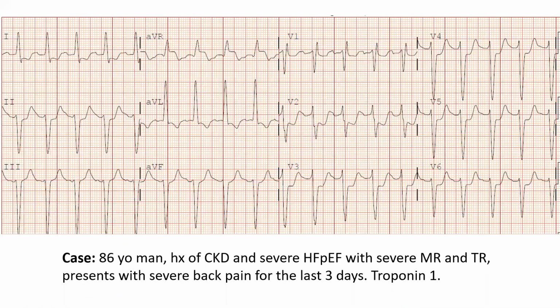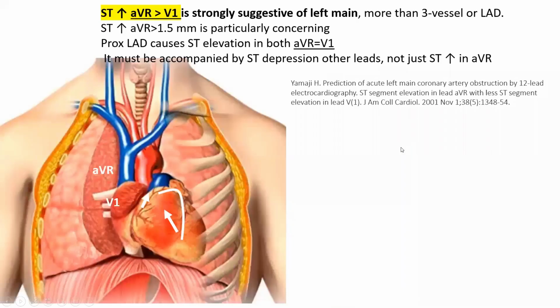I'll tell you that most often when I see a similar EKG, maybe not as pronounced, but similar diffuse ST depression, most often in my experience it is not even severe ongoing primary myocardial ischemia. Most often in my experience, this is actually secondary myocardial ischemia, like profound anemia, a profound shock from another reason. You have a patient who's coming with fever, pneumonia, septic shock. You get diffuse ST depression with ST elevation in V1 and AVR. You have a patient with COPD and profound hypoxia as he's getting intubated. His O2 sat is 60%. You get that EKG. So beware of that EKG.